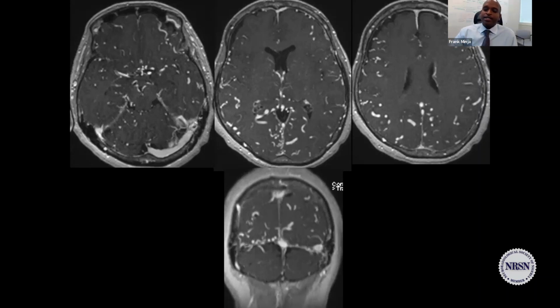The veins, these are veins, right? This is a very important concept here. If you look closely, down here you're going to be dealing with a carotid. The point is the arteries always branch and get smaller. You can't have a tree that's a huge mother trunk and then a branch that's bigger than the mother trunk. It's not going to happen. So the artery always branches as you go distal.